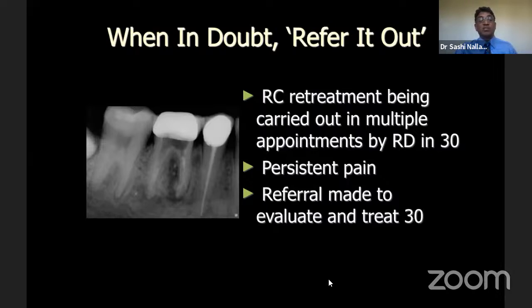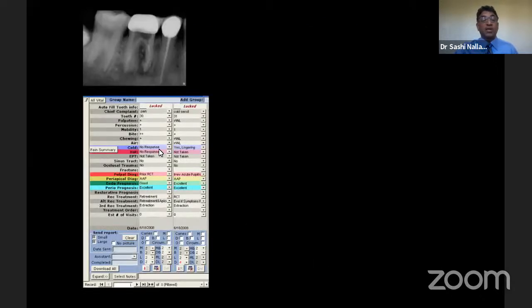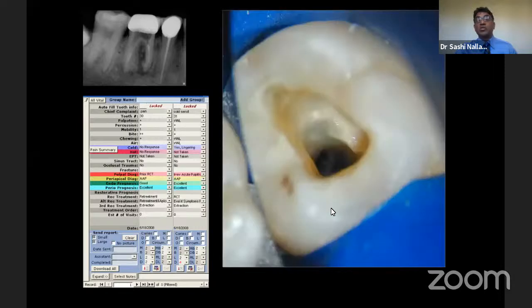And when the patient came to see me, when I tested the tooth, obviously the problem, as you can, I don't know if you can read it, number 30, the first molar, is not the major issue, but number 31 is the one that has severe lingering cold sensation, and that's what the patient has been feeling, not so much what's happening in tooth number 30. So when I checked tooth number 31, I don't know if you can see it, but there is a crack on the distal marginal ridge going all the way down here. So the problem tooth is actually this, not necessarily this. And the dentist spent months trying to fix this tooth, not understanding that the problem was in 31.